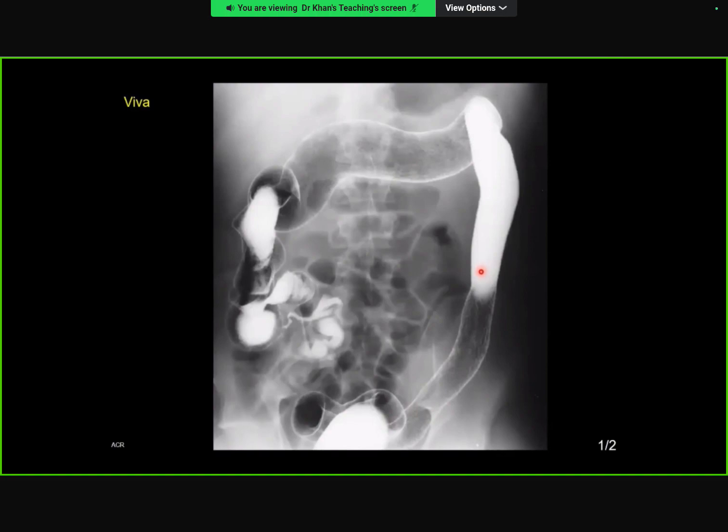Typical barium contrast enema demonstrating loss of haustra and visualized sigmoid, descending, transverse and ascending colon on this single spot film. This almost kind of lead pipe appearance of the colon. There is probably some. So what is your conclusion? The features are consistent with ulcerative colitis.